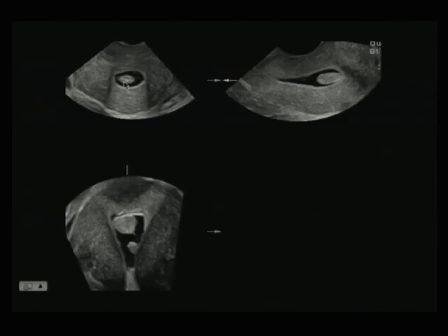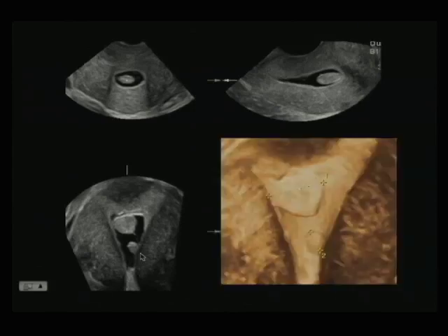On the other hand, once you have the volume and you're reconstructing it and navigating through the volume, then you can identify perhaps this second little polyp, which you may or may not have seen originally, but you certainly have a picture of it, even if you didn't. And here's a surface rendering of these two polyps, which makes for a picture which has some depth.